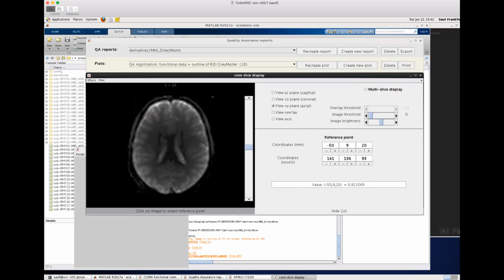So those are borders of the brain, and borders between the brain and the CSF, the ventricles. Anywhere that has CSF shows a high contrast because they have different average BOLD signal values, and to a lesser extent gray matter and white matter, but those are relatively minor compared to the difference between outside and inside of the brain, or CSF versus gray matter. So boundaries between gray matter and CSF, and boundaries with air, are the two places where you see huge motion-related changes in the BOLD signal.